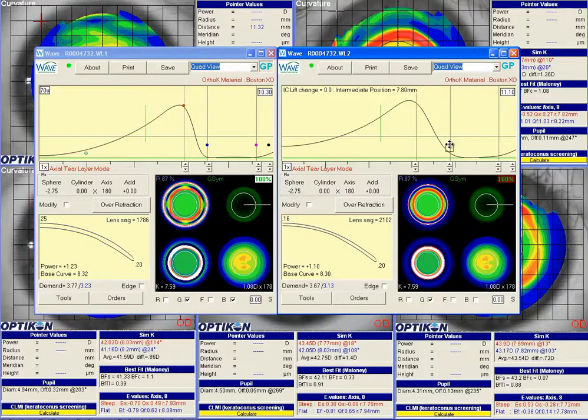And then instead of having a reverse curve that's 1 full millimeter wide, I think I might bring this down to 6.8 so that it's just over half a millimeter wide. And really all that does is it gives us more lens in the periphery that will land on the cornea and align. We do need to readjust our power.